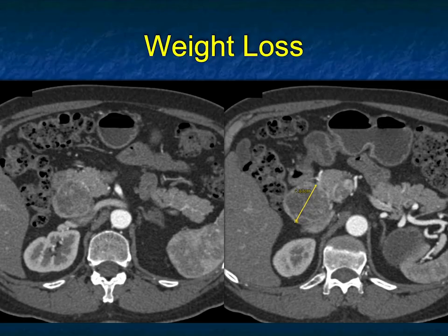This patient had weight loss. There's a mass in the head of the pancreas, somewhat vascular, somewhat well marginated. I got to be thinking this is probably coming from pancreas rather than duodenum. If it was coming from the duodenum, I would say a GIST tumor or a carcinoid. Coming off the pancreas, I got to think about a neuroendocrine tumor. It doesn't have the look of adenocarcinoma, doesn't look like a SPEN. That's a possibility. Doesn't look like a serous cystadenoma.